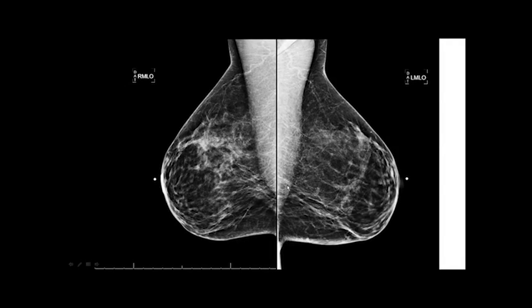Here's a pretty good example. There's a few things wrong here, and I did these. These are mine. The muscle's wide superior, the convex border down past the nipple, which is great. The bottom of the breast is horizontal. The nipples are in profile. There is a tiny fold up here in the muscle. I should have tried to get that out. Beautiful IMF over here, but over here there's not as well visualized IMF.